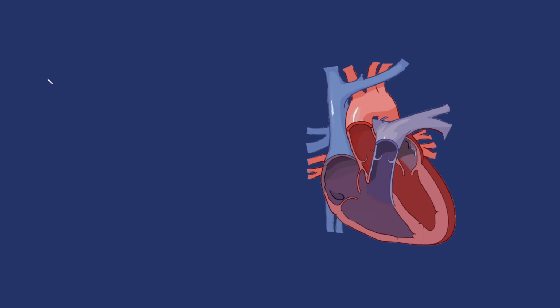And that's where we're going to look at our QRS morphology for leads. I use 1 and AVF. And that's going to tell us what direction the general signal is going. Okay, so typically, both of these, we're not going to draw P waves or anything on this. We're just going to do mostly upwards deflection on 1, and there should be a mostly upwards deflection on AVF.